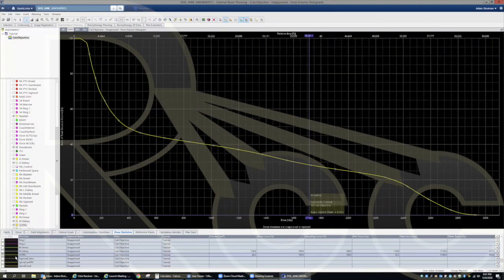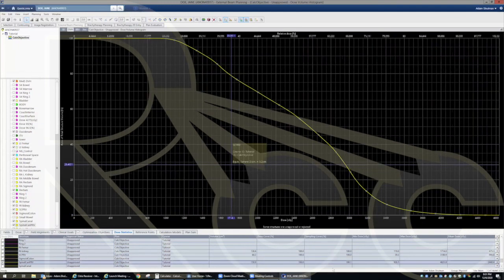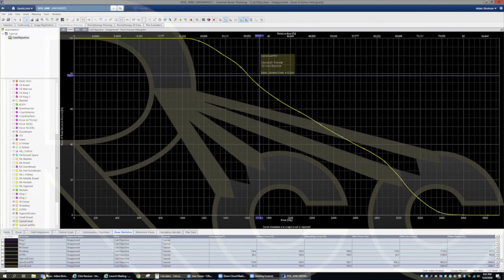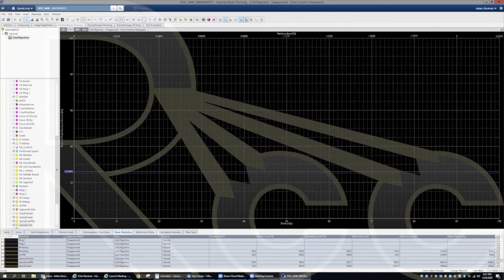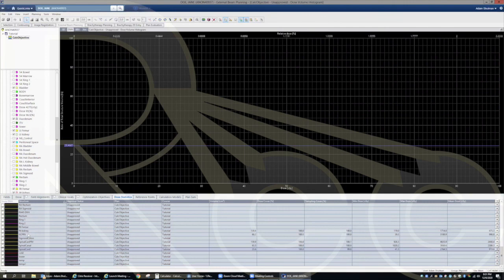Spinal cord PRV, max of 31. Spinal canal PRV. This is when I said that we could lower it. I just ignored it in those final steps. We could have fine-tuned that down to about 44.5 just by spending that extra 10 minutes. Spinal canal, though, is at 39. Had that little bit of overlap. Spinal cord, low, 27. So yeah, you want to see anything else? Oh, that's good. That was great. So it's pretty darn close. Yeah, very good.